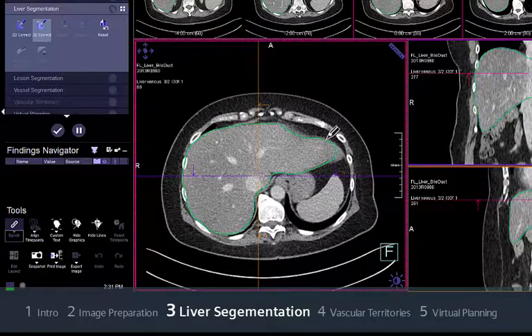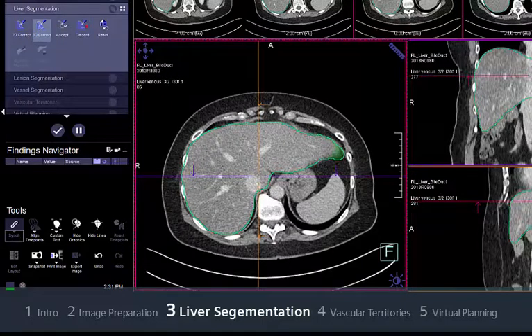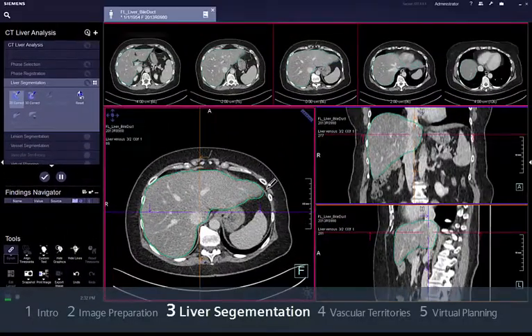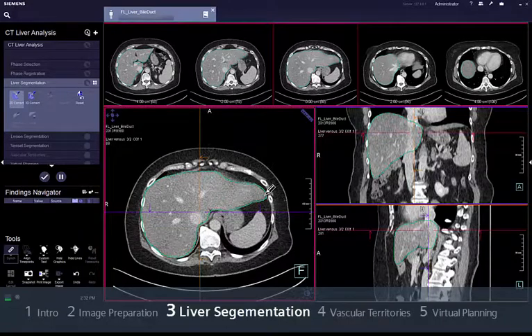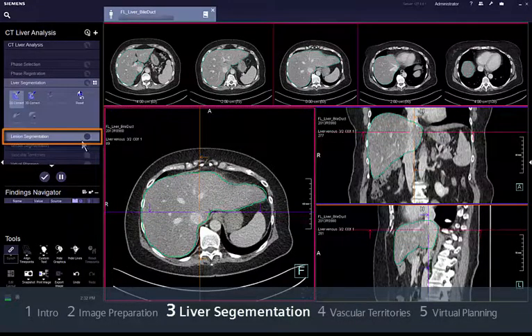Start using the 3D Correct tool to perform rough changes, since your correction will automatically be extended to the neighboring slices. Use 2D Correct for fine-tuning, where you only want to modify the currently displayed slice. If you are satisfied with all of the inputs made in Step 3, go on to Step 4, Lesion Segmentation.